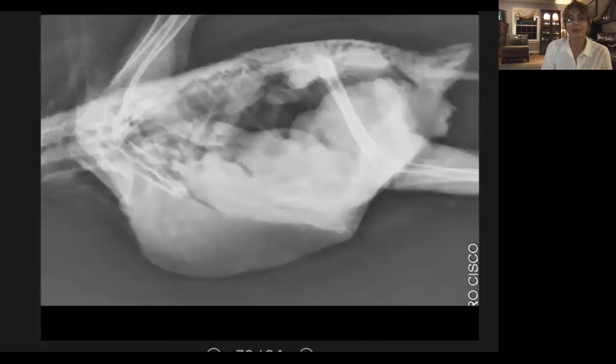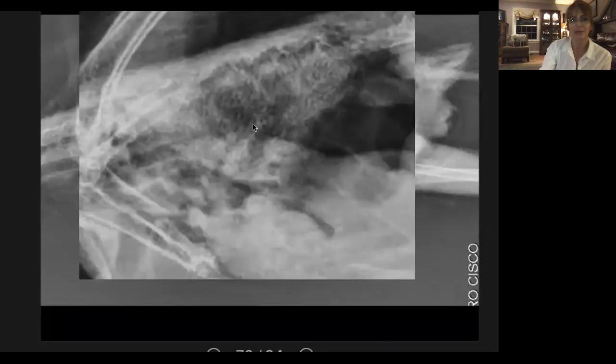And this is another example of pneumonia, and this was aspiration pneumonia in this fairly young bird that the owner was hand feeding. And from a distance here, we can see that this looks fairly normal, but then once again, we're losing that honeycomb pattern. And if we look really close up at it, here's where we had that sort of normal looking, and then you see almost like these little tree branching areas where the bird aspirated and it went right through the ostia, which is the biggest opening that goes into the caudal thoracic and abdominal air sacs.